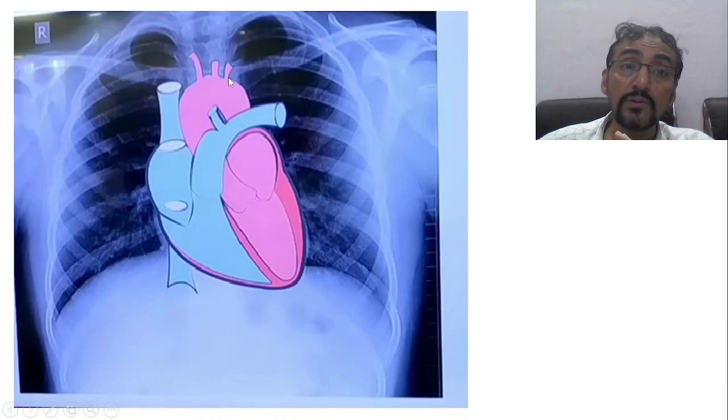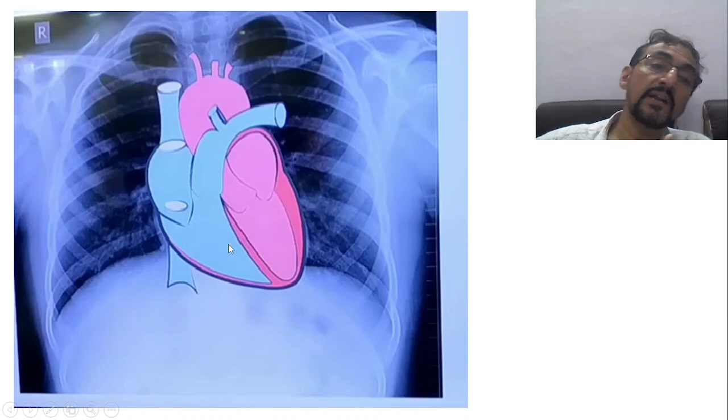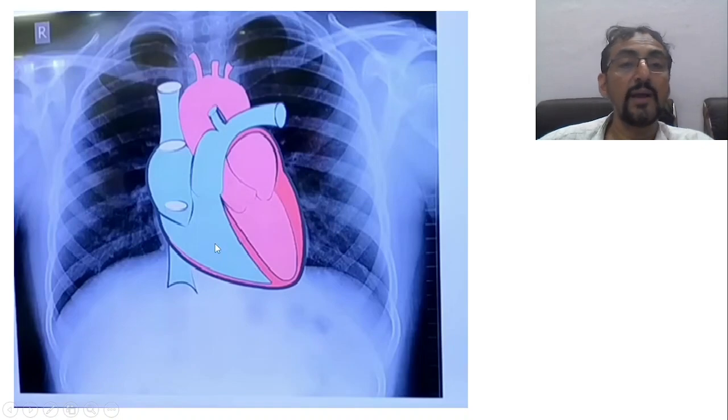और ये वाला portion जो हमें curve दिख रहा था ना, this portion, that is aortic knuckle. Exactly, see where it is, just below the clavicle वो शुरू हो जाता है. Okay, and this is pulmonary trunk उसके नीचे, and this is left atrial appendage, and this is left ventricle. Okay, so this is right ventricle. So right ventricle कहीं हमें side में तो मिलता ही नहीं है. तो ये वाला portion है, ये right ventricle है, तो ये shadow में आ गया, बीच में आ गया.